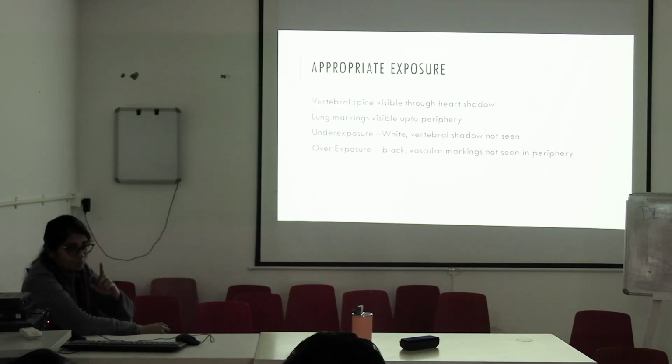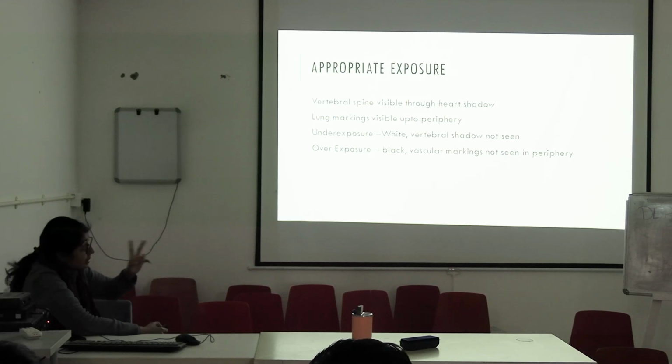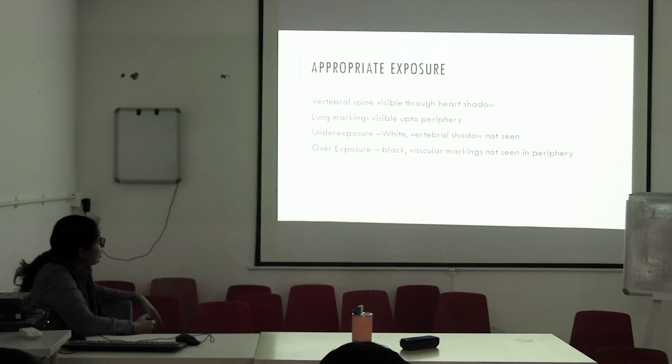Now we come to exposure. So first what did we read? View. So in the end of the class you will be able to describe a chest X-ray point by point. So first is view, second is appropriate exposure. So what do you mean by appropriate exposure?